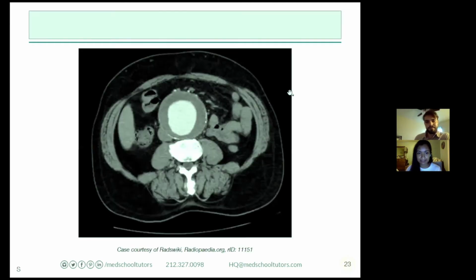All right, so another case here. So again, please throw in what you think it might be. But I'll take you through what I'm looking at here.